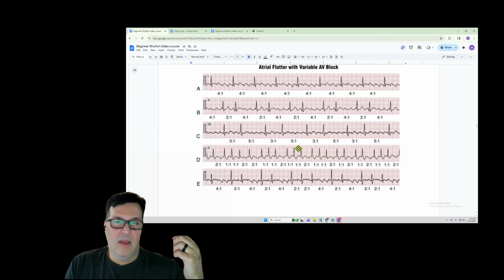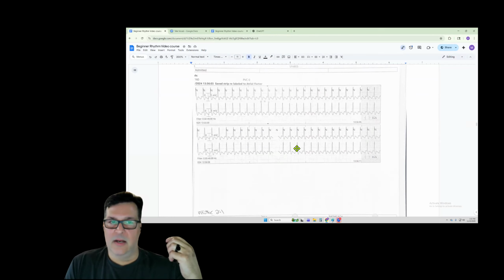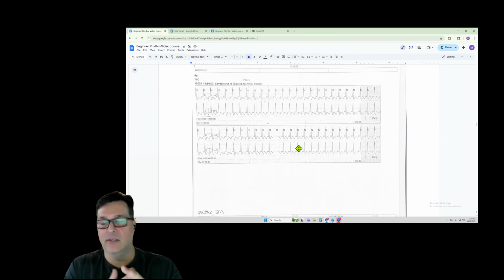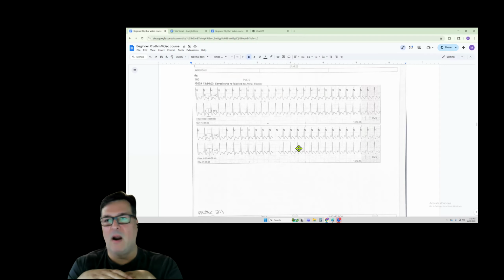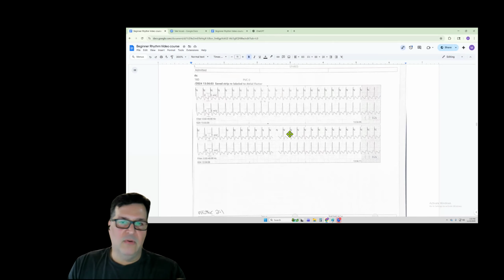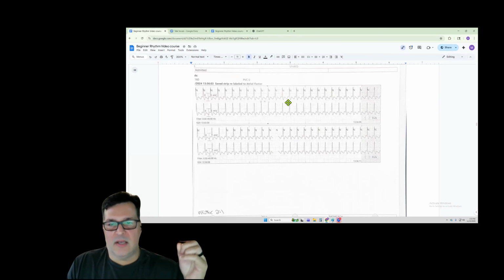Same thing down here. And what Emily was saying, sometimes it can look like sinus tach. When you have a 2-to-1 flutter, just a classic looking 2-to-1 flutter, you could quickly look at that and say, oh, there's sinus tach. But that heart rate is rarely ever going to fluctuate from 150. The heart rate trend is going to be consistently 150, and it's never going to move until they break. And then this little notching, this sawtooth pattern between the RRs, is a classic looking 2-to-1 flutter.